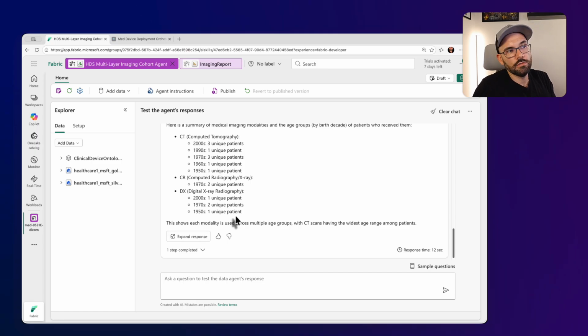For X-rays, only 2 unique patients there, so that's underrepresented. If I'm a researcher, maybe I would go in and take a look and see why that is, right? This is great. This allows me to identify folks based on maybe a condition or which type of images they've had done. That's wonderful. But what if I want to see like a giant overview or report?